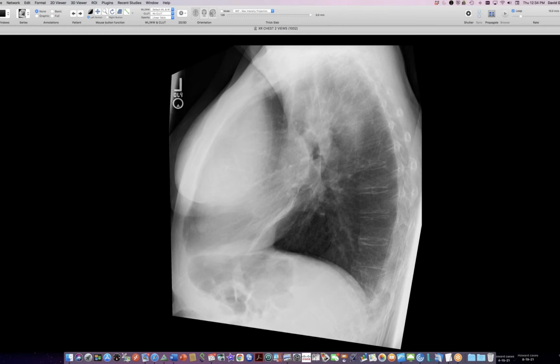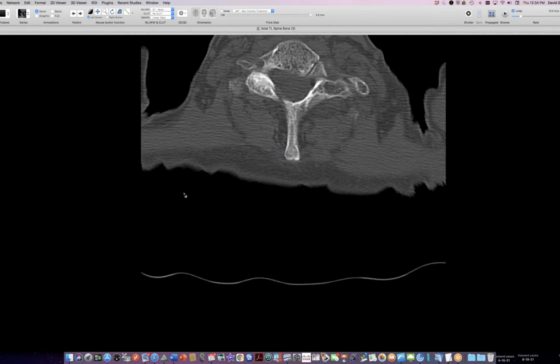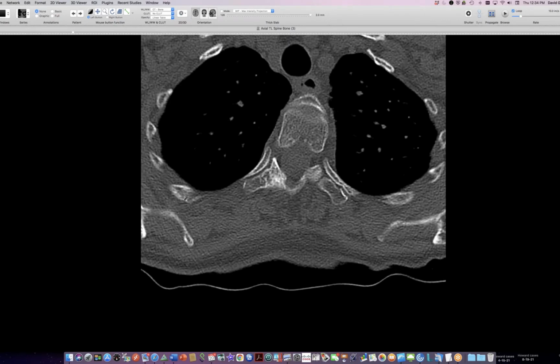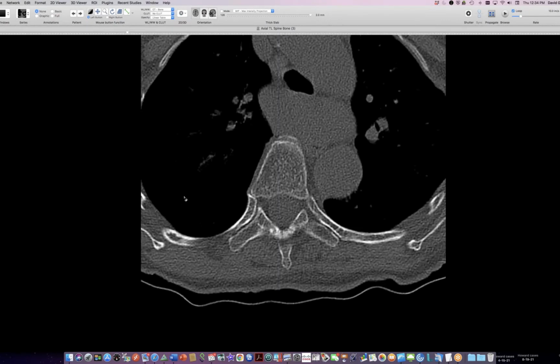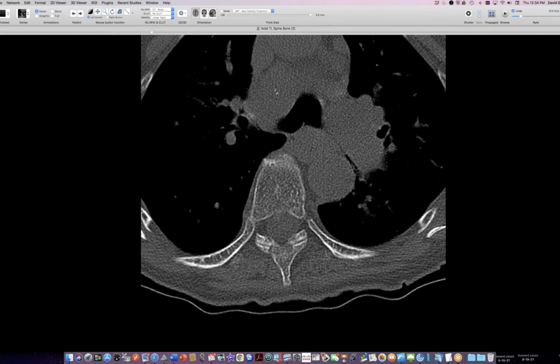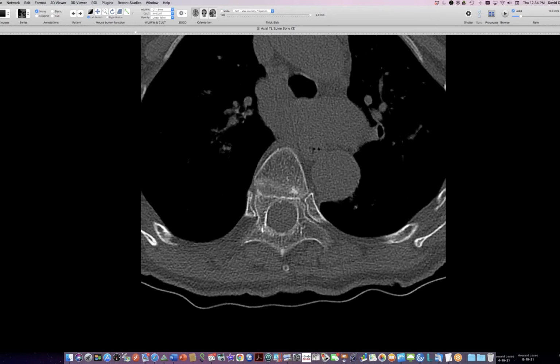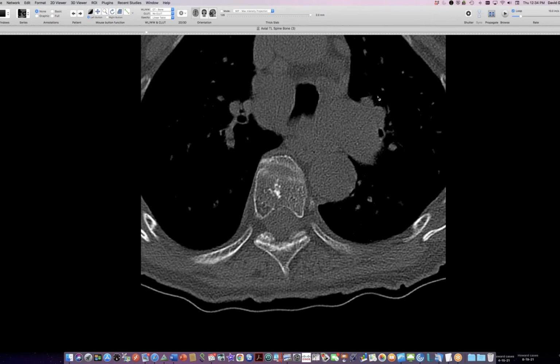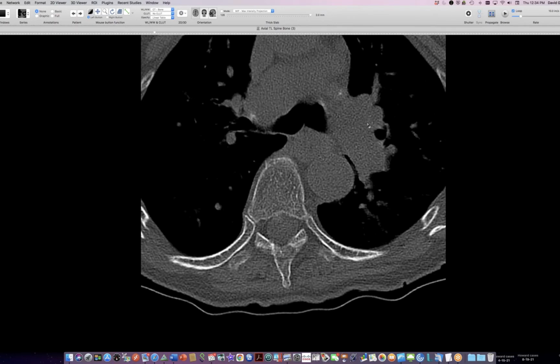And this condition was not actually diagnosed because people's attention was really focused on the spine. But the nice thing about spine CTs is that they include some more interesting parts of the body. And so we can see that there is a lesion around here at the carina, this big smooth tube here, which heads out into the left lung and becomes the left pulmonary artery.